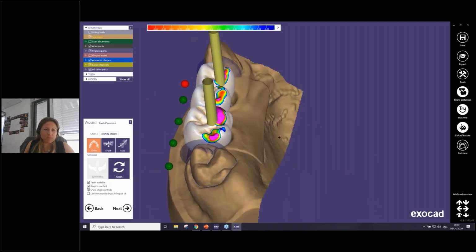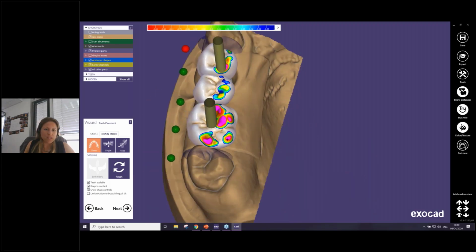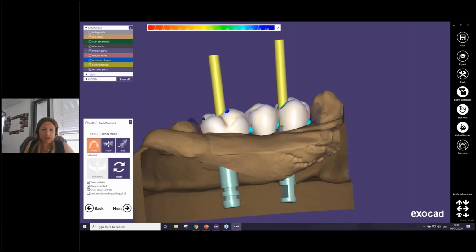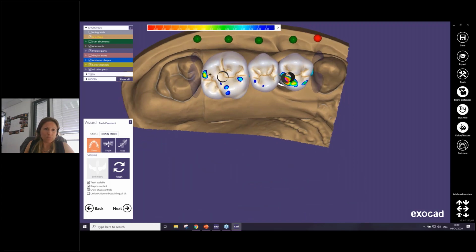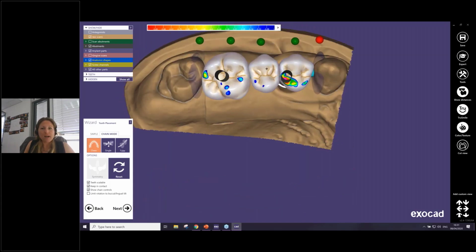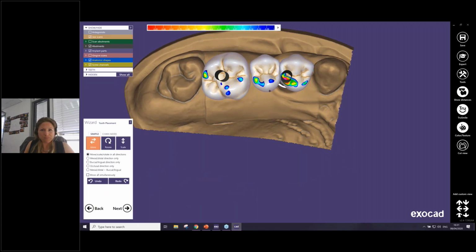So you have possibilities to change the position, you can change the height, you can also scale and rotate the frame. Everything is open. So if I'm okay with this position, let me check here. I will change this a little bit.